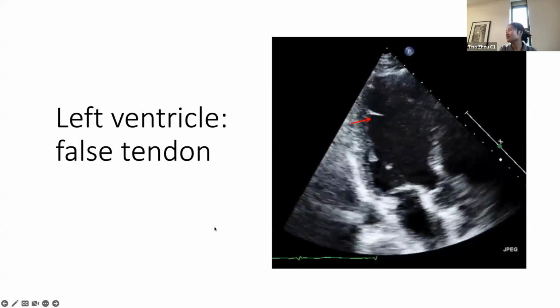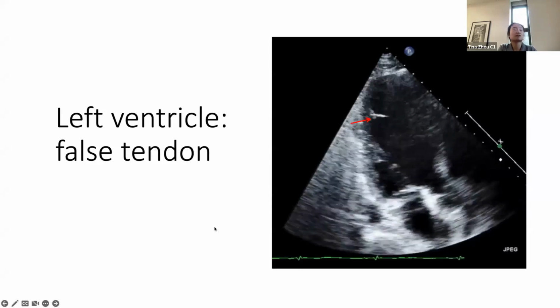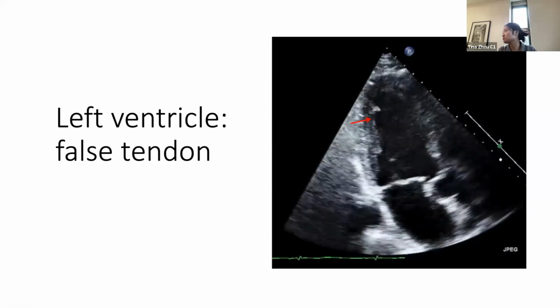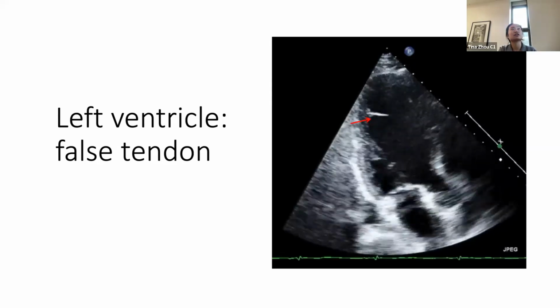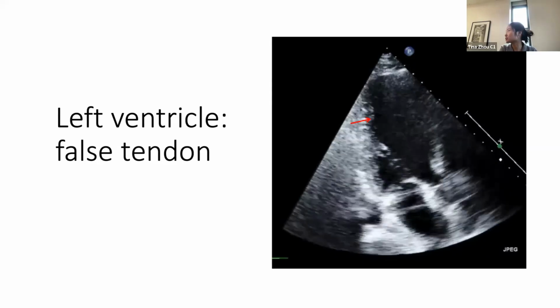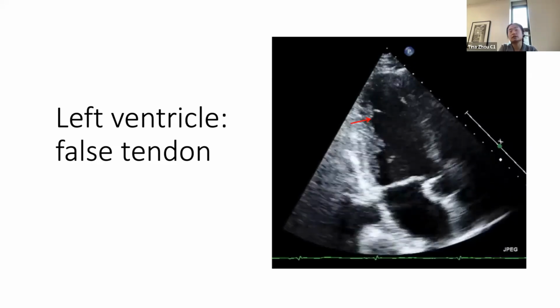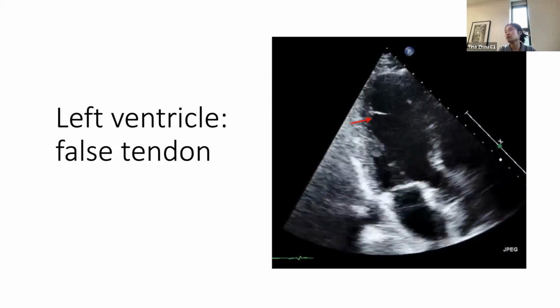Generally, no significant clinical use, but it can get ruptured when it gets dilated. It could potentially be a source of ventricular arrhythmia, but how commonly that happens, and whether it warrants intervention, is really not the case.